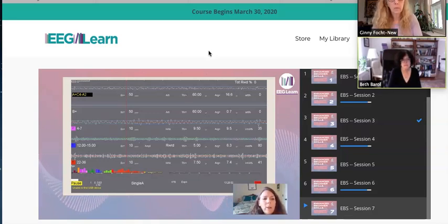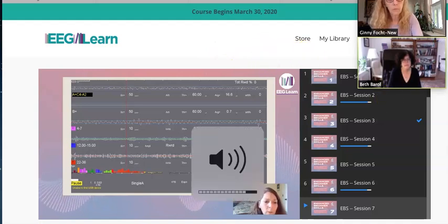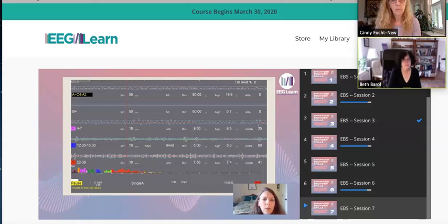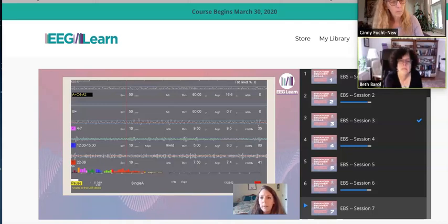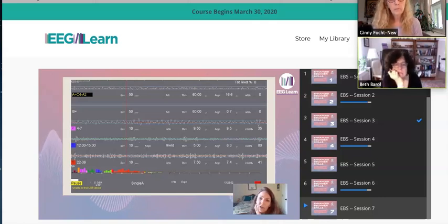And then when we look down in the filtered bands, we're inhibiting 4 to 7, rewarding 12 to 15, inhibiting 22 to 36. So I want to look over at the average amplitudes to see which frequency band seems to be the issue in this person's EEG. And like I said before, their EEG looks overall pretty good.